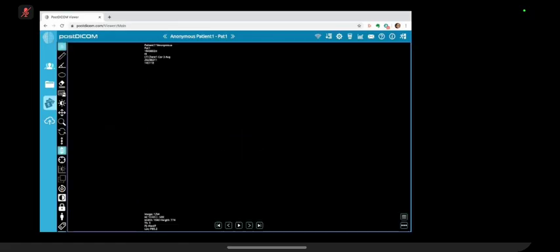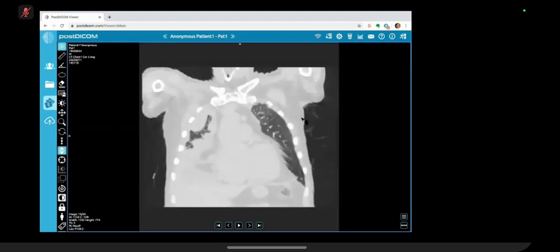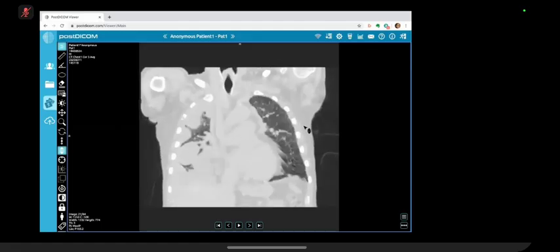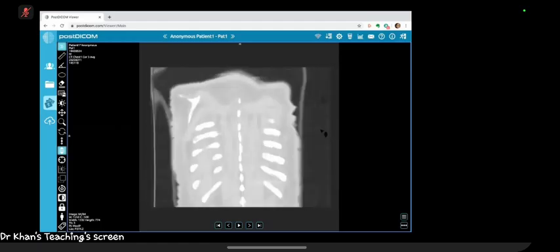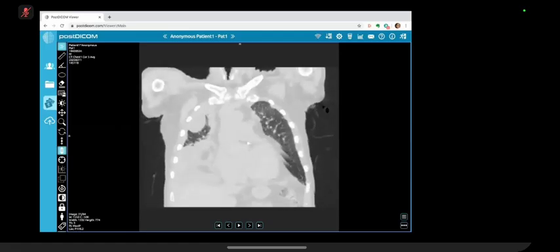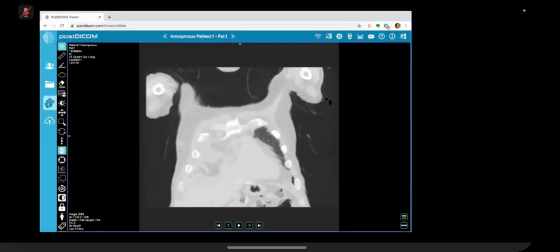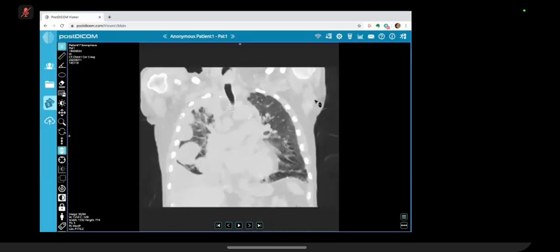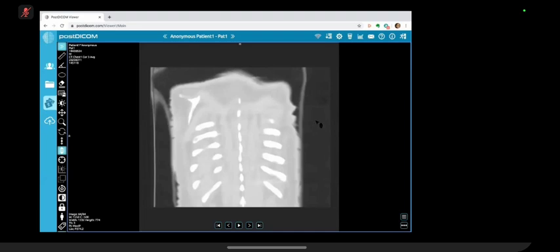As suspected on my previous X-ray, I would be suspicious of diffuse pleural involvement, and I would ask about any history of asbestos or other industrial exposure, but this pleural thickening is suspicious for a malignant process. I can probably just see tiny calcifications at the base on the right pleura. Again, I would be thinking along the lines of a mesothelioma, and the second differential would be pleural-based metastases, but unlikely given the one-sided involvement and loss of volume on the right side.